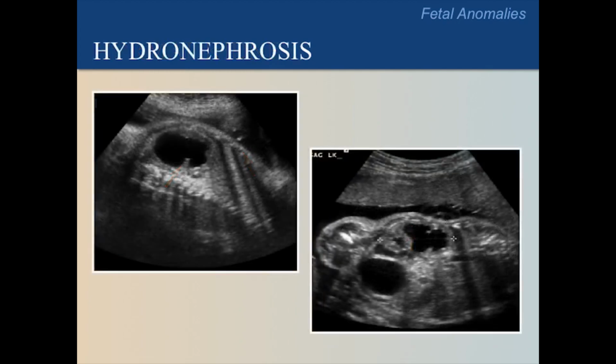This is how kidneys will appear on ultrasound when hydronephrosis is present. These kidneys are blocked, so they are filled with urine, which will appear black. Hydronephrosis usually involves dilation or enlargement of both the lower and upper regions of the kidney. There are several things to notice about these images. First, notice the dilated renal pelvis filled with urine.